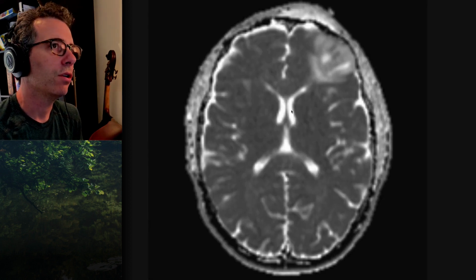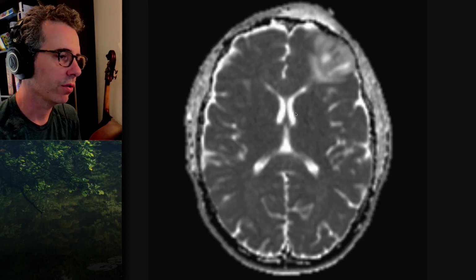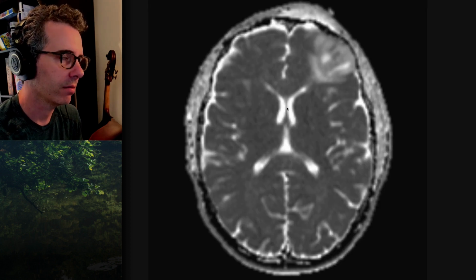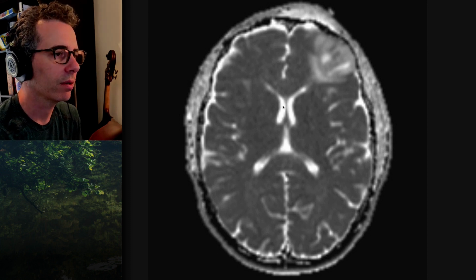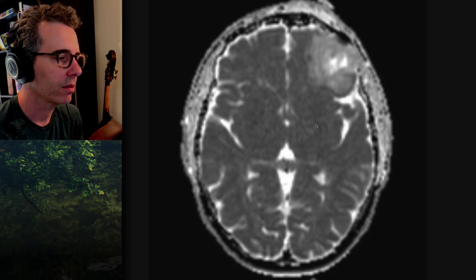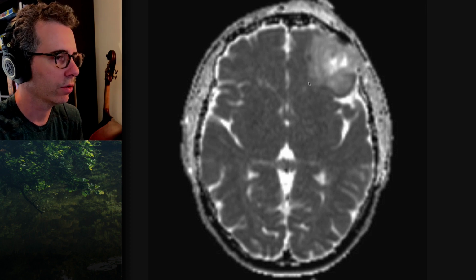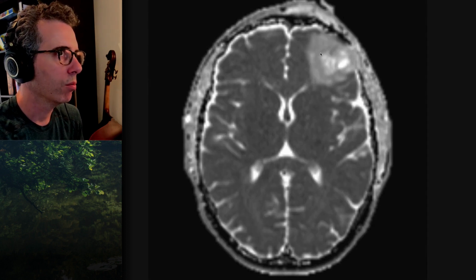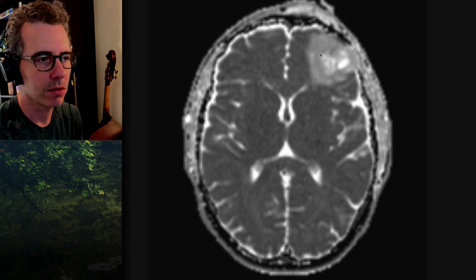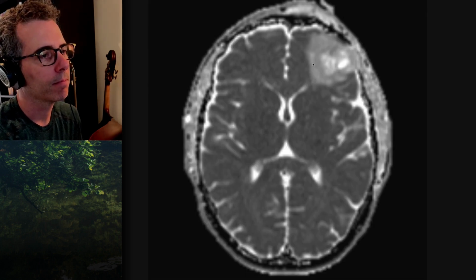And so if you're talking about no diffusion restriction, the only thing on this image that shows essentially no diffusion restriction is CSF. And even that diffusion restricts a little bit because those water molecules are bumping into each other, right? So brain diffusion restricts a lot. Normal brain is quite diffusion restricting. And this area shows facilitated diffusion compared to normal brain. So it's not normal brain, but it's not more diffusion restriction like you might see in a stroke or in, say, lymphoma or an abscess. Yeah? Okay.